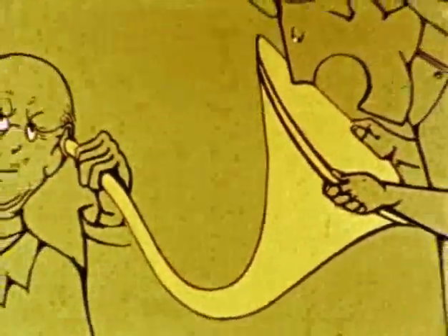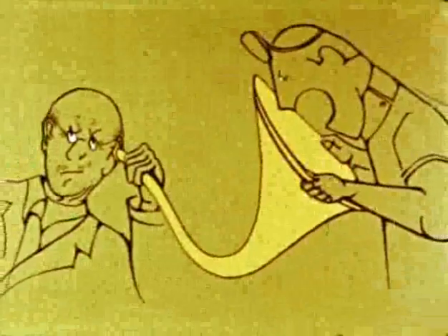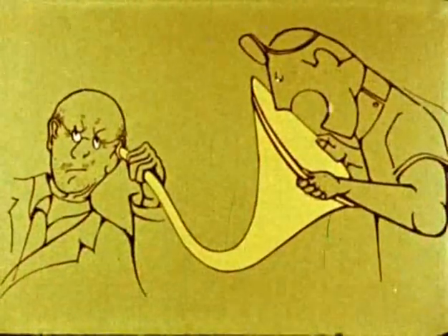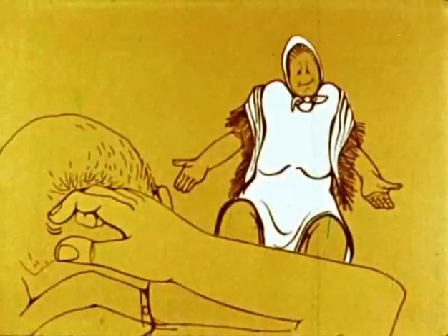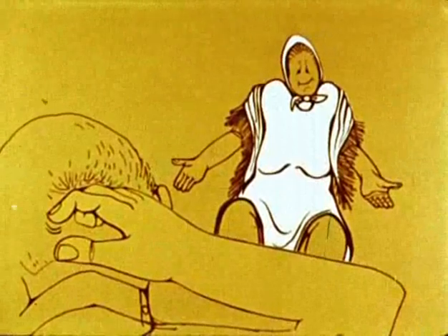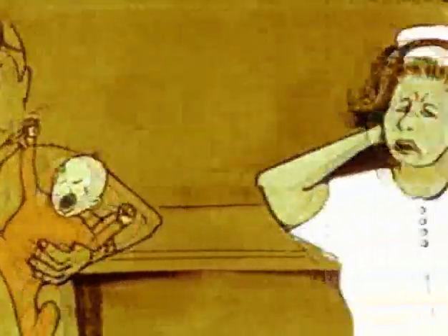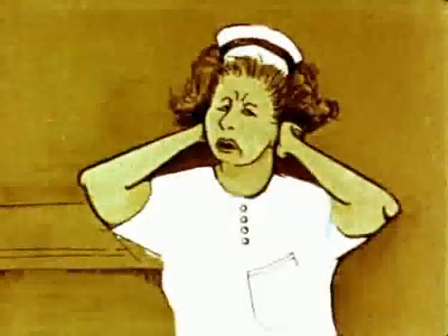The accurate diagnosis of hearing loss has long been beset by problems. Many of these would be resolved if it were possible to measure simply and accurately the sound transmitting characteristics of the middle ear mechanism. What is going on behind the tympanic membrane? Is there a pathological lesion or a language barrier? Serous otitis to be resolved? Or is there a lesion of the nerve?